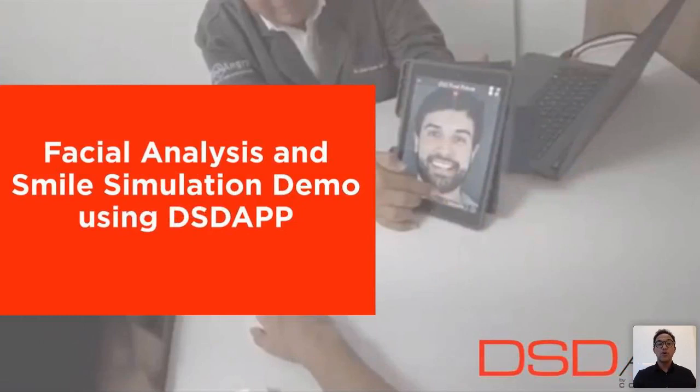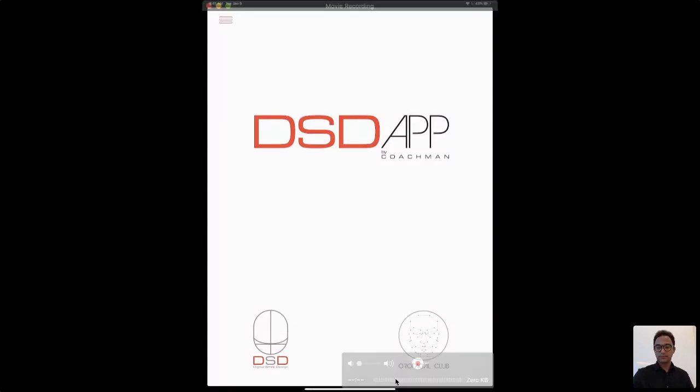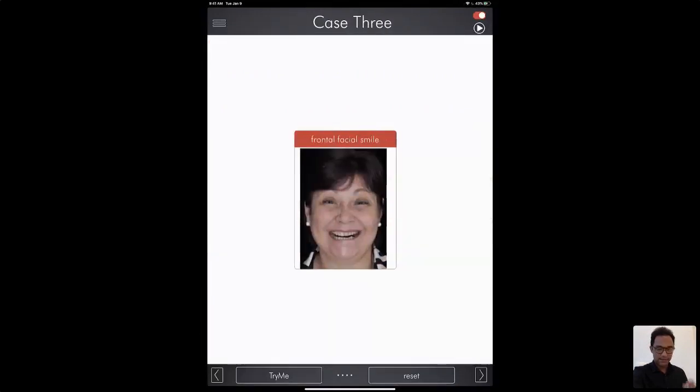So here, let me show you. I'm going to share my screen, and let me show you how amazing the app works. Okay. Perfect. I'm getting my app here. So here we have the menu button. I have here this patient on Try Me. Let me select this patient, for example.